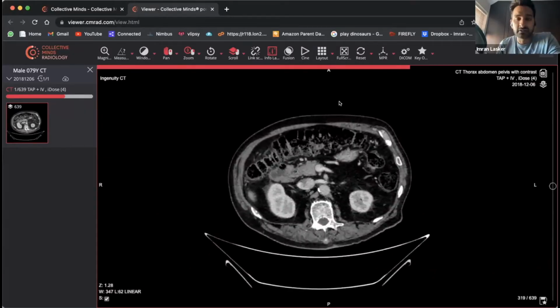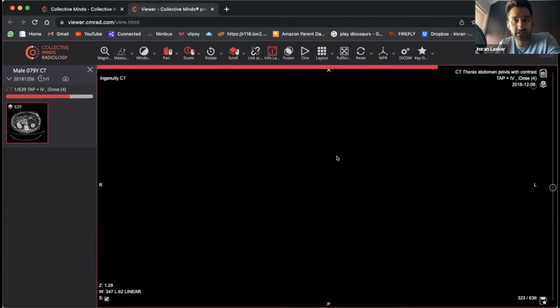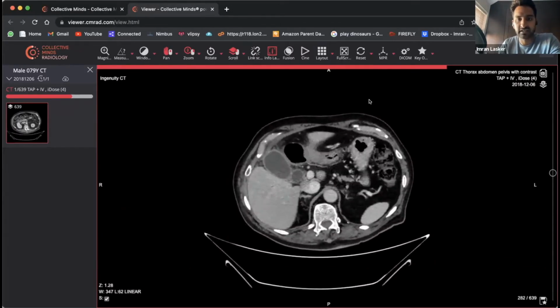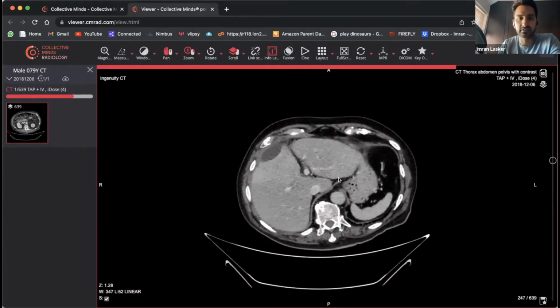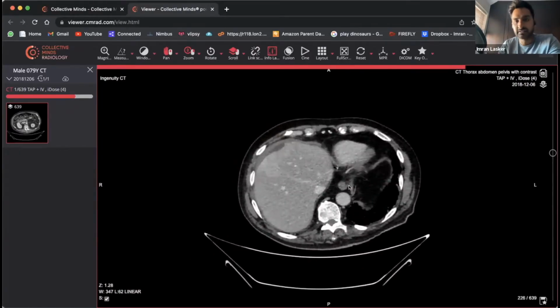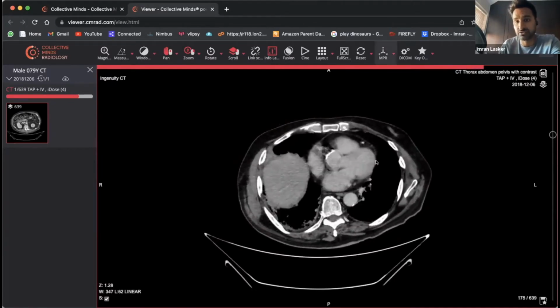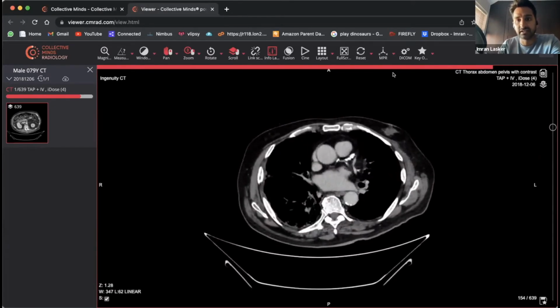Okay, so we are going to be looking at this patient. They have got abdominal pain. For those of you who are able to get through the scans quicker than me, go ahead and write whatever you think is going on in this study. I'm going to work through it slowly, because not everyone is coming here with the same ability. Some people are ST1, some are just thinking about doing radiology in the first place and are very interested in looking at scans, which is a great place to be, by the way.